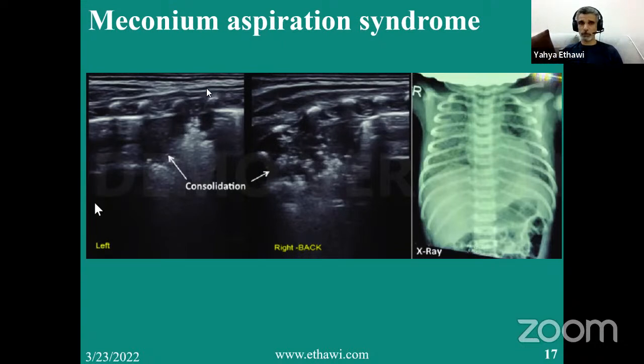So you can see abnormal, normal, or at least grade 5, grade 4, and grade 1, grade 4, and grade 1. So pneumonia is either localized or translobar. If it's translobar, you'll never see normal. And if it's lobar, you'll see an abnormal area and the rest are normal. Then you will not see another abnormal. That's usually how you differentiate, especially if the lesion crosses the ribs. So between the ribs, you have normal, abnormal, normal, abnormal, and so on. And of course, the history will help you. Absolutely.